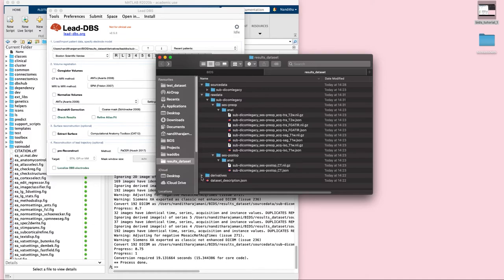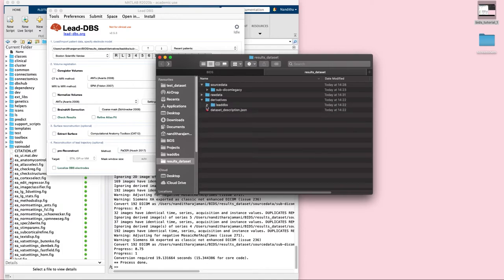The next folder is the derivatives folder. The derivatives contains the main output from the processing tool. The first level of the derivatives folder is the Lead-DBS folder. So if you run some other pipeline which is also BIDS compliant, for example fMRIPrep or even Lead-Group for that matter, it will dump all its data into another folder at the same level as Lead-DBS.